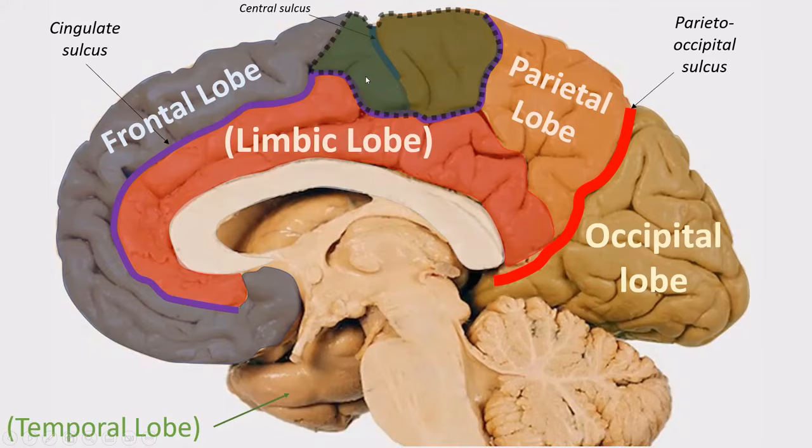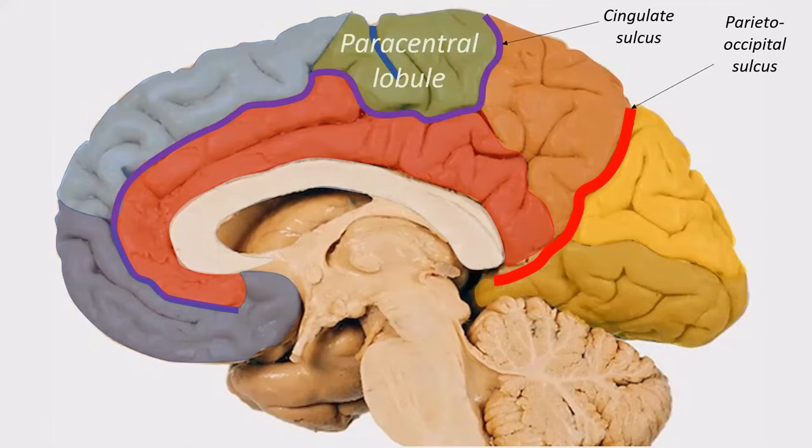And this contains the motor representations of the contralateral leg on the frontal part, or the anterior part, and the sensory representations of the contralateral leg situated in the parietal part of the paracentral lobule. So does a lot change in the image when we discuss the very specific remaining sulci and gyri that we haven't discussed already? Well, basically not much. So I kept the paracentral lobule because we already know it.